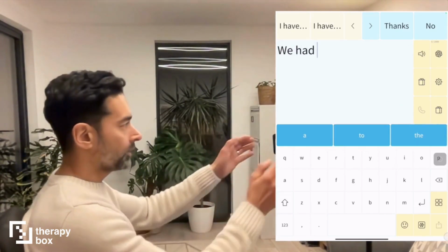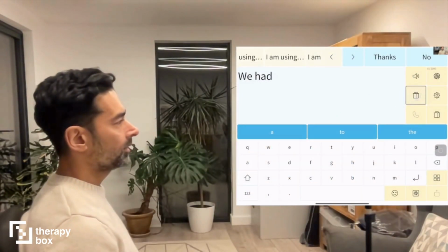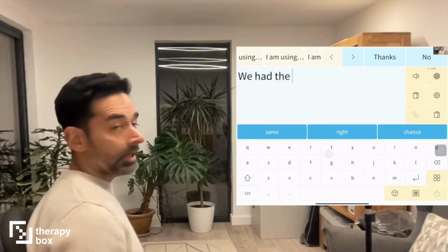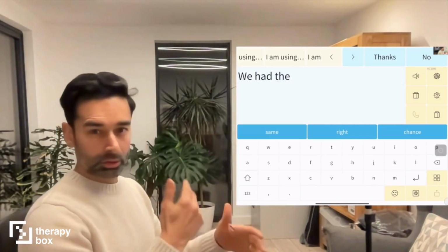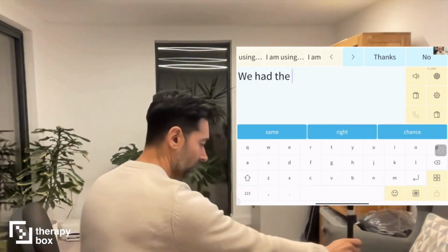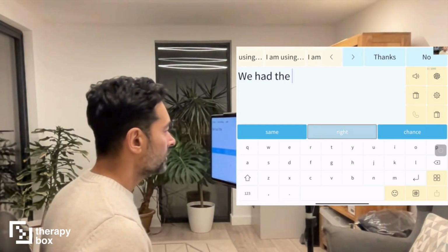Now I'm going to turn my orientation, and then I'm going to go onto my iPad. You can see that I'm still able to run it. Now, this would be unthinkable in the world of eye tracking. Just change of orientation and lose the frame of reference. But not just that, I'm going to actually move the device forward. I'm going to come quite close to it, and it still works.